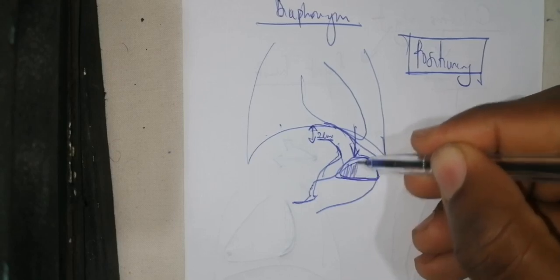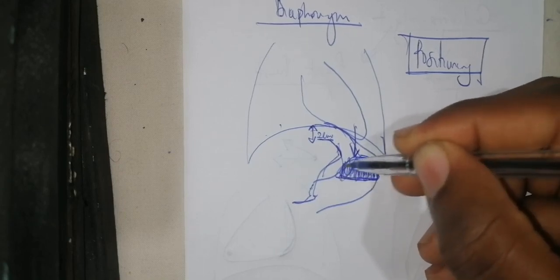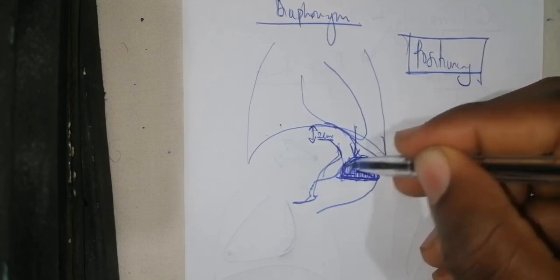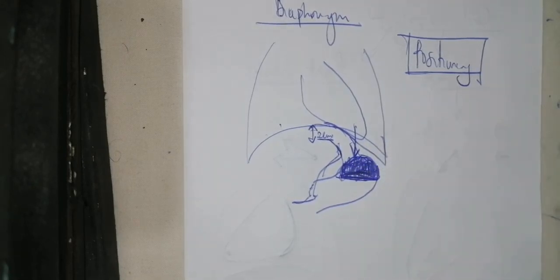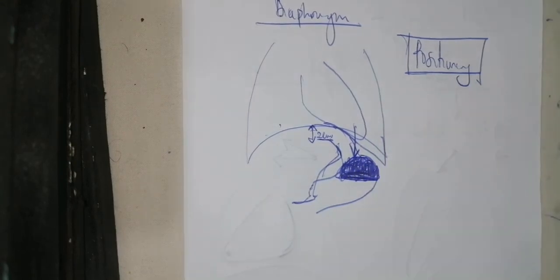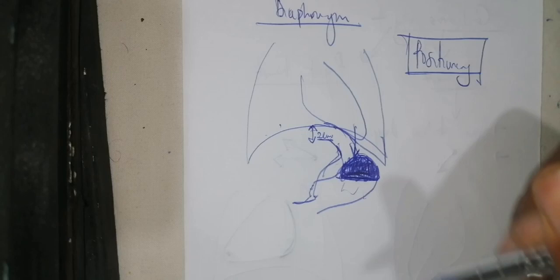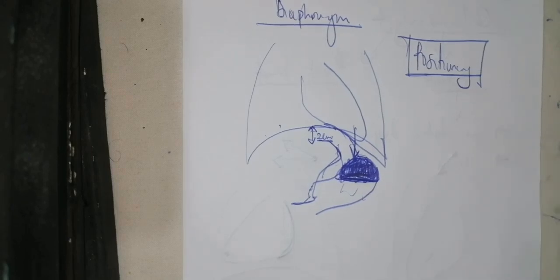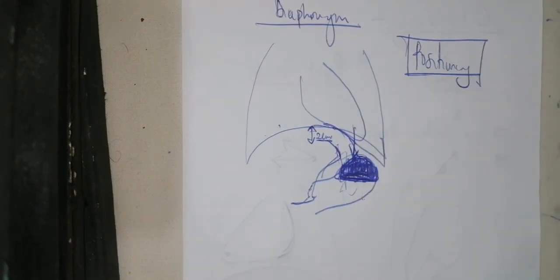If you see a dark gastric air bubble, it is very likely that the patient was in an erect position when taking the X-ray. When you see a large dark gastric air bubble, the patient was erect. But if you see a small air bubble, the patient may be seated when taking the chest X-ray. And if you see no gastric air bubble, it means that the patient is lying flat, or the patient has not eaten, or has eaten too much.